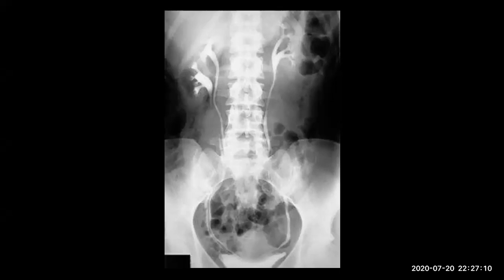IV contrast. Intravenous urography of the bilateral kidneys shows a duplication of the right kidney and the ureter until reaching the bladder.